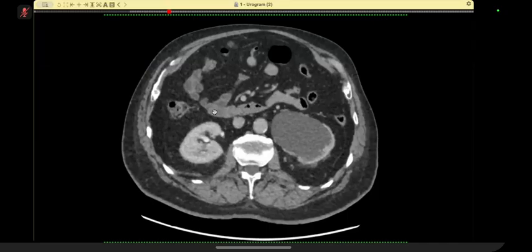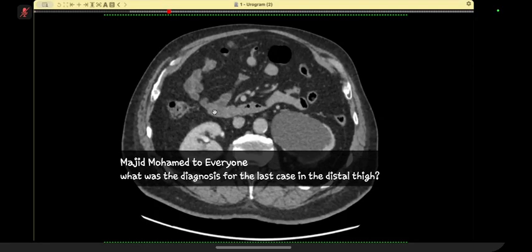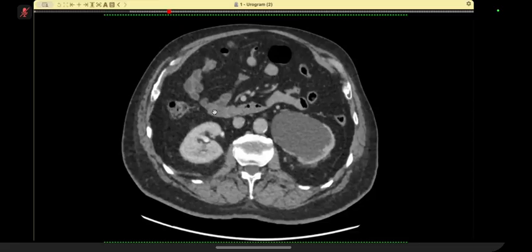The patient is 62 years old, and on ultrasound, which was done for some other clinical reason, gross hydronephrosis was picked up on the left side, and we have done a CT urogram. Over to you. Ask for the mouse, please.